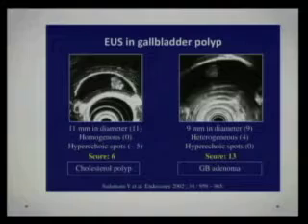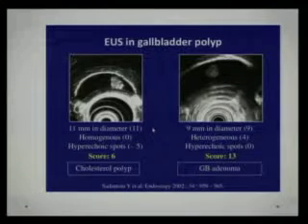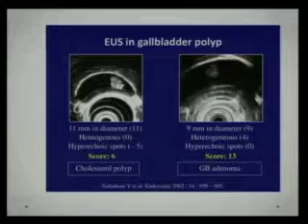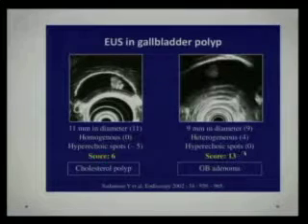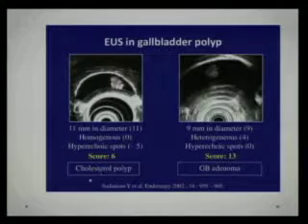So this is a patient who had a homogeneously echogenic, fairly sessile polyp that is 11 millimeters in diameter. And did it have any hyperechoic spots? They said 5. In this patient, this was 9 millimeters in diameter. It was heterogeneous, and did it have any hyperechoic spots? Apparently 0, so the score was 13, and therefore this was an adenoma and this was a polyp.